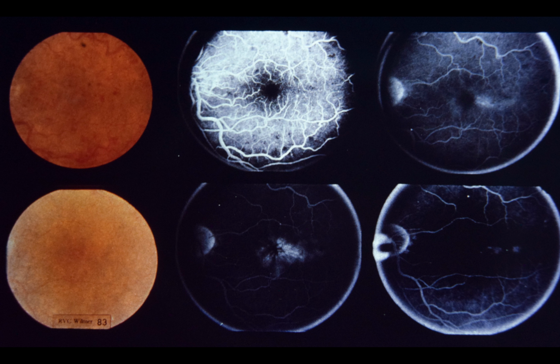The media were clear. The right eye was normal. Upper left, note dilated tortuous veins and multiple superficial and deep hemorrhages in the left macula. Upper center, note early dilatation of perifoveal capillaries 20 seconds after dye injection. Upper right, note early cystoid macular edema 15 minutes after injection. As the systemic disease improved in response to treatment with intravenous Cytoxan, the fundus picture also cleared.